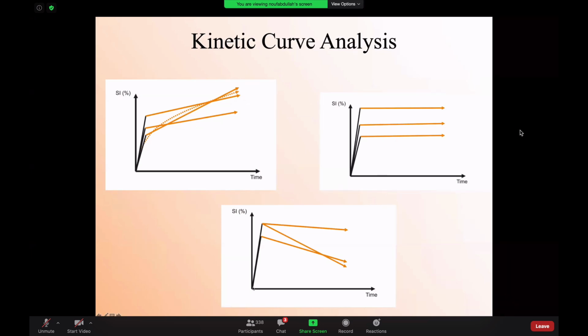If you see that the lesion is taking up the enhancement immediately, and then over the 6 minutes, it's washing out, this is suspicious. This is usually found in malignant lesions. So progressive, plateau, washing out. Benign, could be benign or malignant. This is malignant. So this is your kinetic assessment of the enhancement.